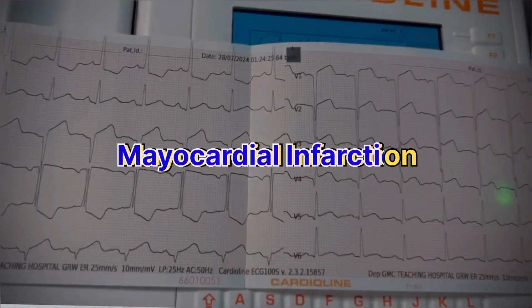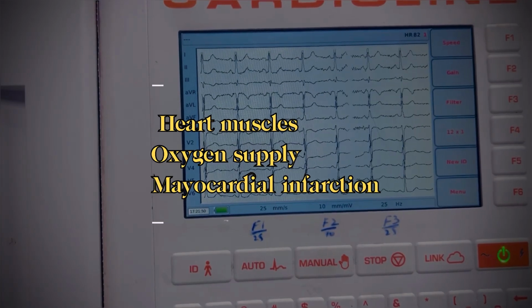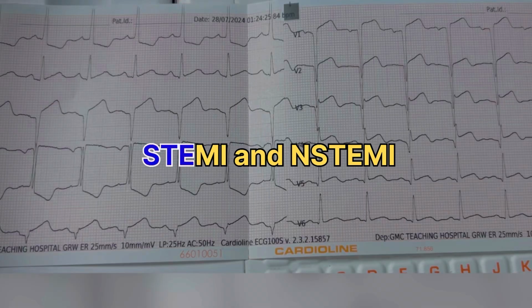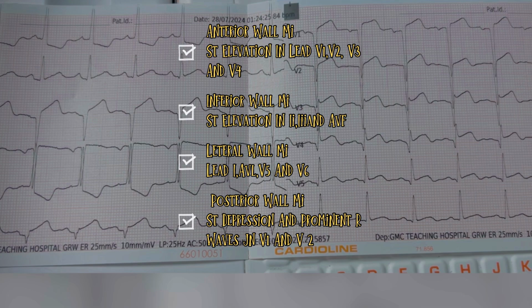Now let's look at the ST segment. It helps us to identify myocardial infarctions. There are 2 types of heart attacks, STEMI and NSTEMI. In STEMI, the ST segment is elevated. In NSTEMI, there are T wave changes or ST segment changes, but there isn't any classic elevation as in STEMI. Based on the location of elevation, there are 4 types of STEMI: ST elevation suggests infarction in the anterior, inferior, lateral, and posterior wall of the heart muscles.